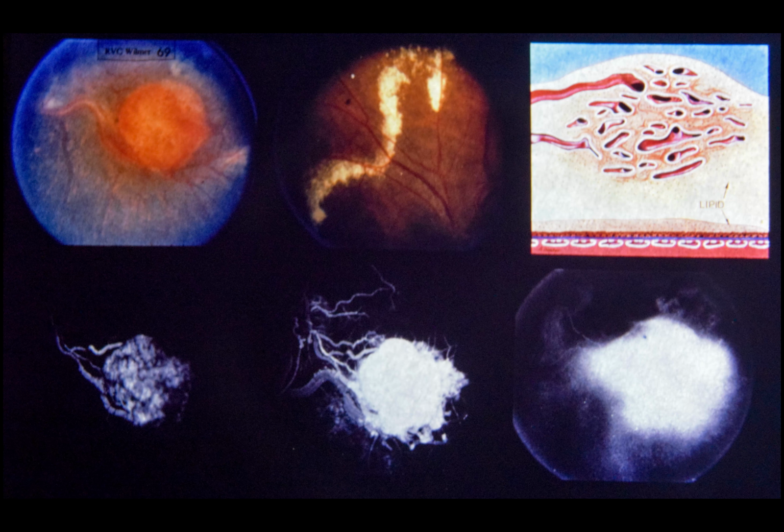Of particular interest in this case was the presence of fine neovascularization on the surface of the tumor. This was appreciated by careful observation of the early frames of the angiogram, as in the photograph lower left. Surface new vessels were also seen when the fluorescein angiogram was examined with a stereo viewer. Tumors without surface new vessels have a relatively smooth edge even late in the angiogram. In this case, we see a diffuse scalloped border throughout the entire fluorescein study.